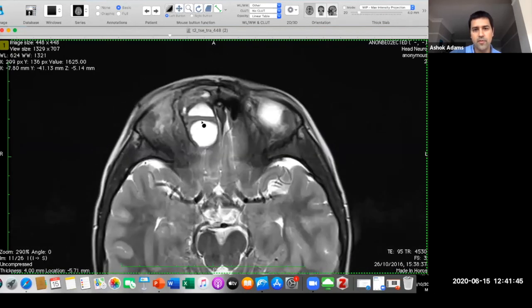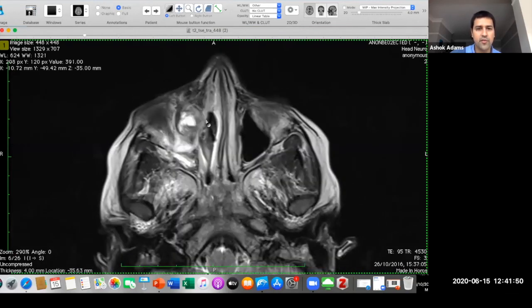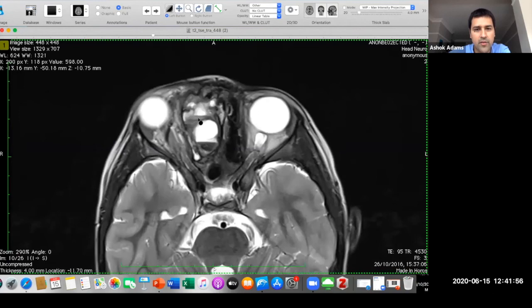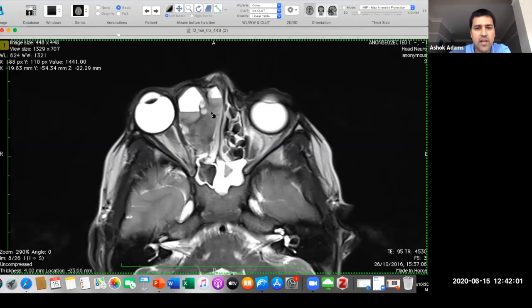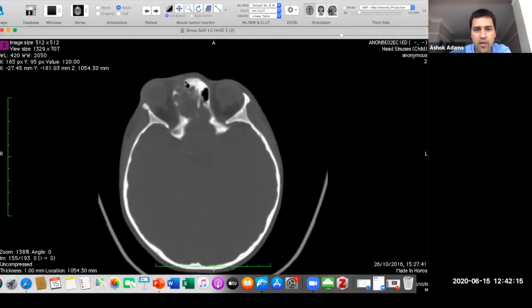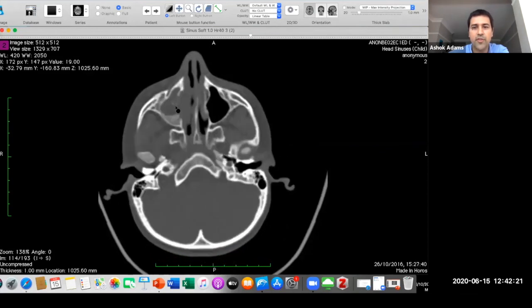Okay, so this is an MRI. This is almost pathognomonic of a certain bony lesion that we see. So this was sold as a query orbital cellulitis, but this was quite a young child and the proptosis had been there for a little while, and you can see here this was a bony lesion with multiple fluid levels. I don't know if anyone wants to hazard a guess in the chat as to the underlying diagnosis, but the take-home point was always being very cautious in looking at bony structures. What I overlooked in this case is the fact that this has been remodeled, and this actually turned out to be an aneurysmal bone cyst, which is difficult to treat and will often recur.